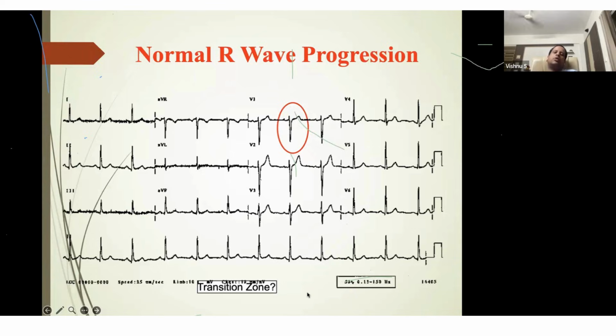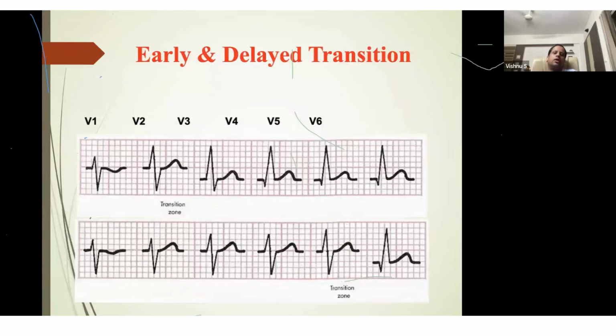And in COPD patients, the heart is usually rotated also. In those patients, the transition will be varied. It can be an early transition or a late transition. So in these patients, you have to interpret the findings carefully. R wave progression in a patient with hyperinflated lungs can be varied due to clockwise and anti-clockwise rotation of the heart. So the transition is also important in these patients.